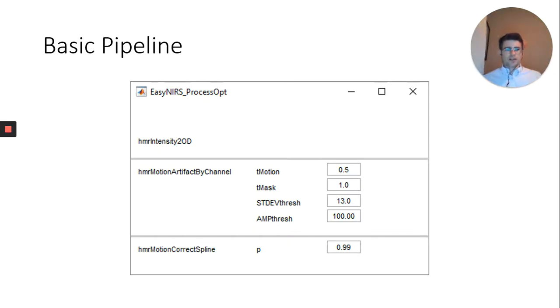If you want to use one and not the other, you basically set the one you want to use to a reasonable value, and you set the other to a very unreasonable value, very, very high. The threshold is so high that the value will never reach it, and therefore you'll just ignore it. So I like using standard deviation because it's standard, so it makes more sense to me.